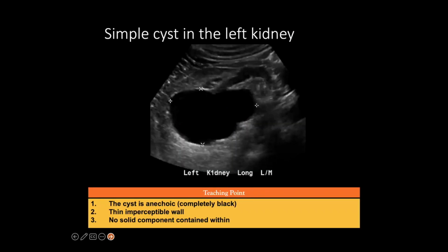So our next learning topic is solid or cystic. And again, this is from our basic rad path lecture. This is one of the most important things that when I get students to try to convey to them, to have them learn over the course of the month, what does water look like on the different modalities? So this is a renal cyst from the left kidney. And we're going to use the correct terminology and describe this as anechoic, completely black.